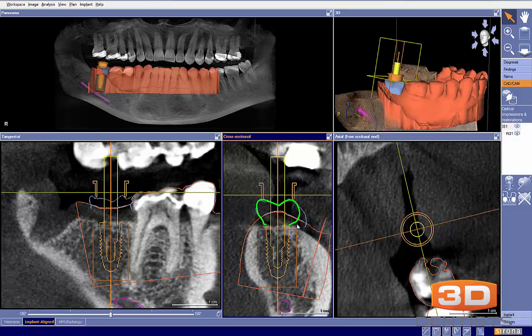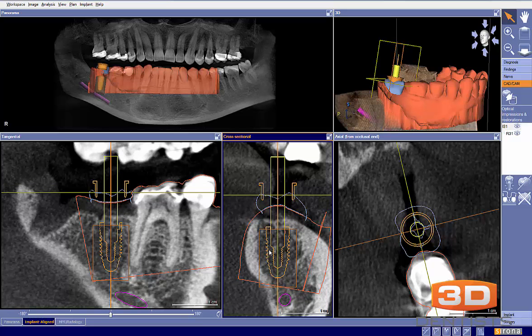That's going to be short. There's going to be a food trap right there. There's a lot of different things going on here. So from the implant to get proper emergence, we've got too quick. We don't have enough space to necessarily accomplish that. So I would, in this particular case, drop my implant down. And now if, for example, I dropped it down to that level, then when I went to design, you could see that I'd have enough space to properly design a good hygienic emergence profile.